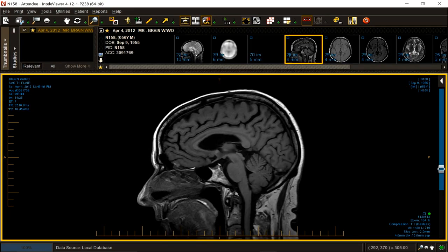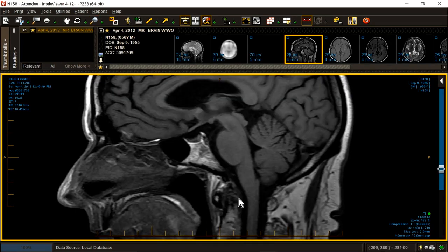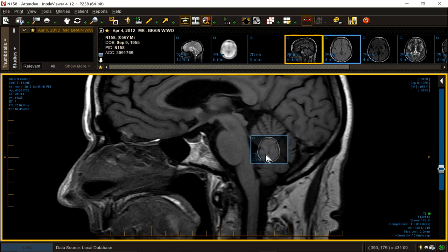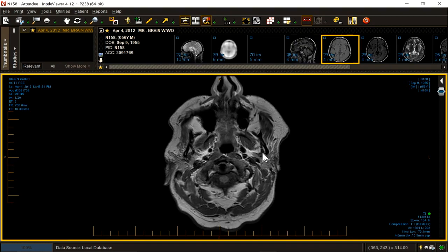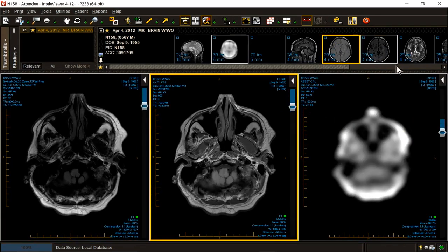While we're toggling around, you might notice the erosive changes of the tip of the dens as opposed to a fresh, clean, zigzag fracture with edema. This is more irregular, associated with some pseudotumorous proliferation. There are erosive changes. This is the typical appearance of CPPD of C1-2. But that might be a story for the spine section, so be prepared. Just a little sidelight entertainment while you are skewering this case. You might have noticed the cases are getting more difficult.